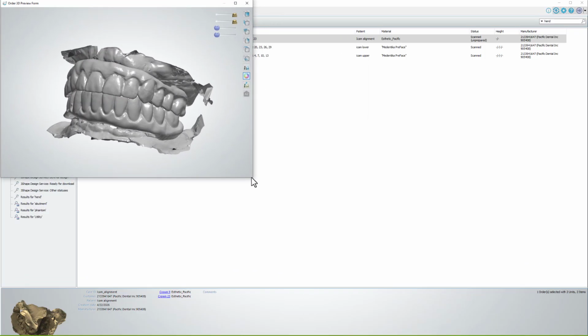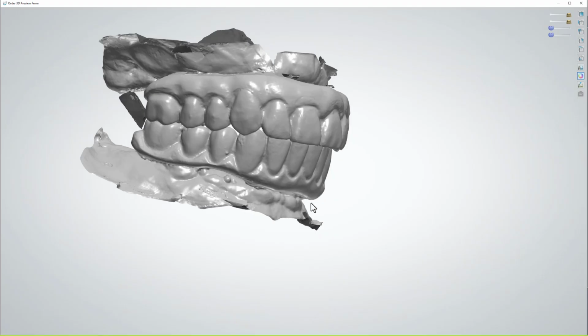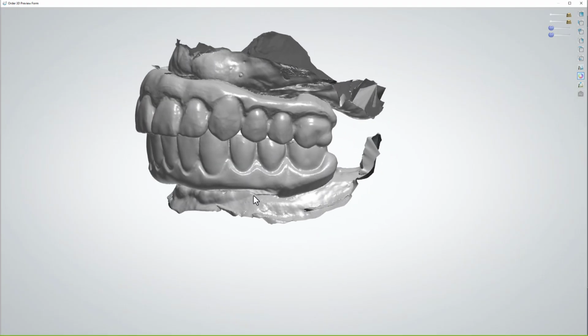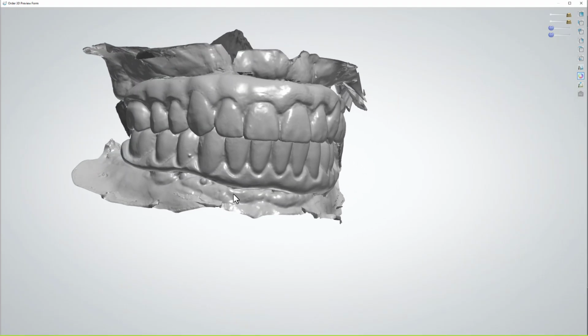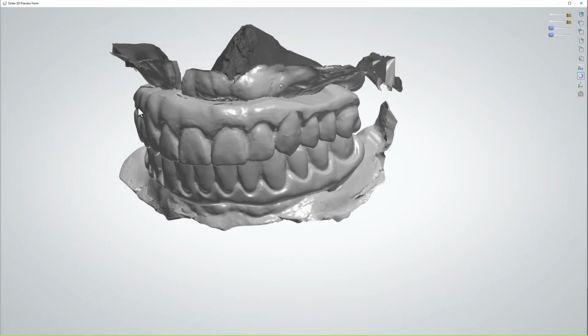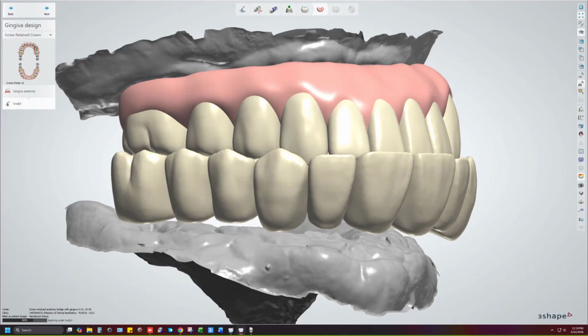You can see how well the lower, see here, see how it's all open. And a lot of conversions are like this. Most conversions are like this unless you spend a lot of time filling and contouring. And look at the upper. Look at how ledged that was, right? You can see how the lower is way better already. And when the upper is done here, at 75%, you'll see the upper is way better. So yeah, it's a win-win on this case.